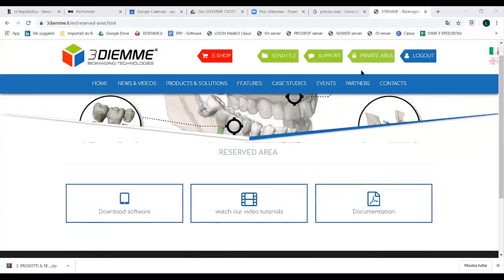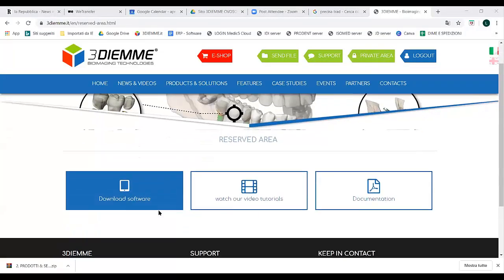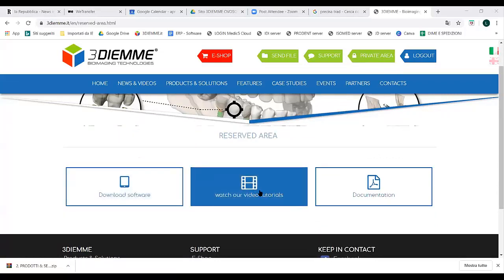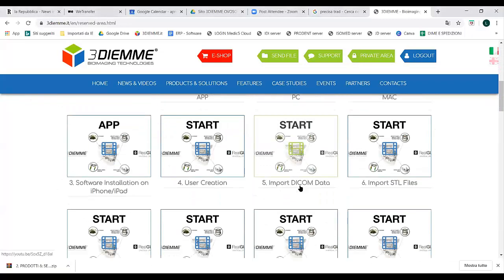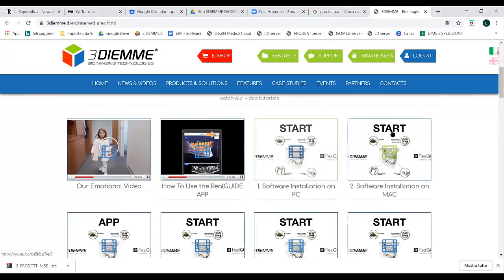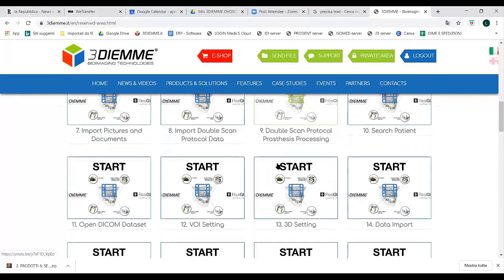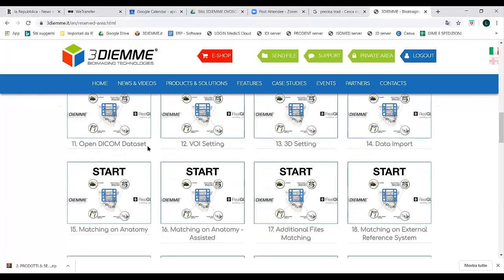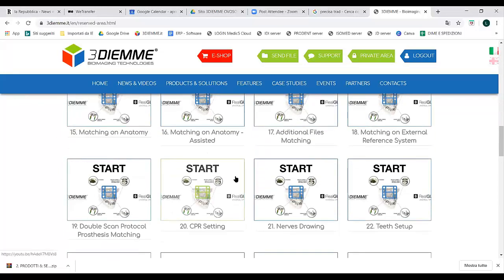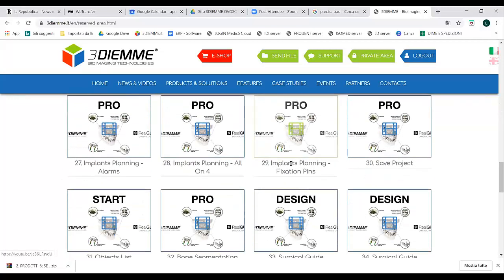Here, as you can see, as Alice said, in the private area you can find the link for downloading the software or our video tutorials. As you can see, there are a lot of video tutorials about our different modules. Start, Open DICOM dataset, matching on anatomy is assisted, CPR settings, nerve drawing, implant planning.